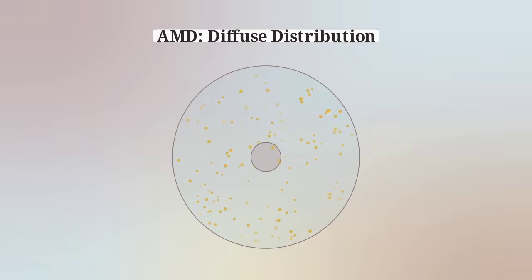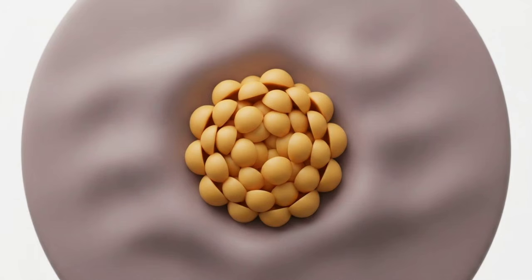The primary differentiator between AVD and AMD is topography. In typical AMD, drusen scatter diffusely across the entire macular region. AVD lesions, however, are rigidly localized directly under the fovea. Isolating this subfoveal geographical constraint exposes the hidden genetic dystrophy that fundoscopy obscures.